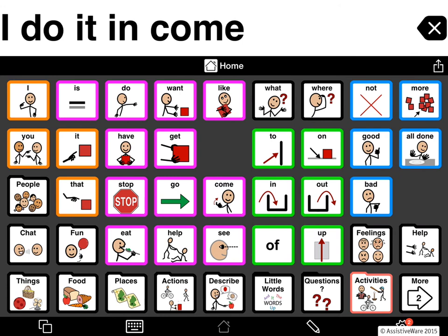Another feature that is really useful for people who, in addition to a vision impairment, have serious fine motor challenges, and that's auditory scanning. You can use the same secondary voice for the auditory scanning cue when you configure scanning in Proloquo2Go.